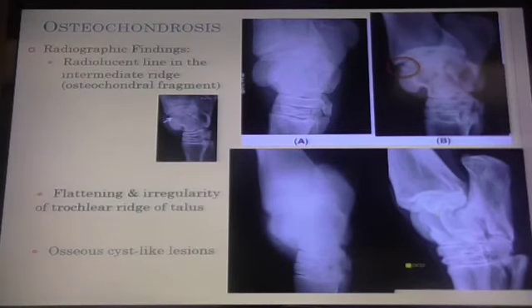So what do they look like? Which view is this? See where A is? Which view is it? Students on my right, everybody see my little pointer? Which view is that on my right? Medial. Medial what?